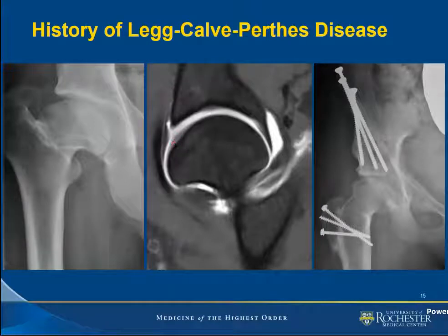To summarize some of the surgical techniques, I chose to demonstrate a patient that had Legg-Calve-Perthes disease as a child, and now they're an adult. Patients who have had Legg-Calve-Perthes disease wind up with a cluster of imaging findings, including a large femoral head, which is referred to as a coxa magna, and a short femoral neck, which is referred to as coxa breva. It puts their greater trochanter in an unusually high position, where you can imagine some external impingement between the greater trochanter and the pelvis.